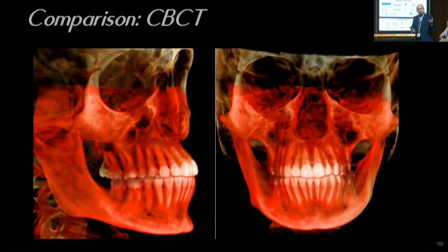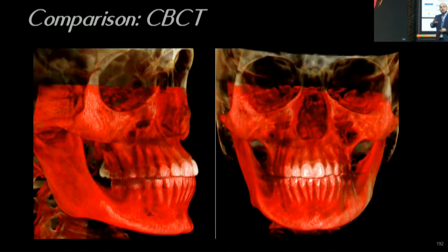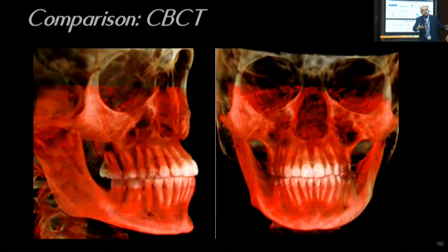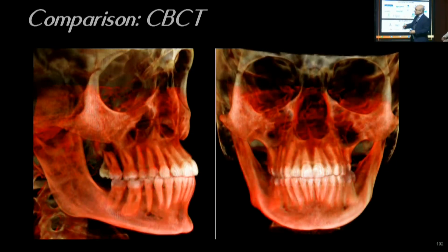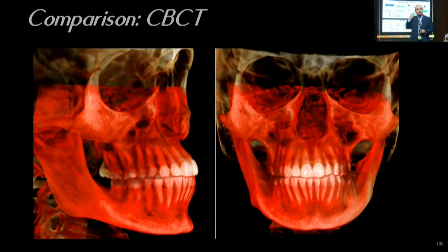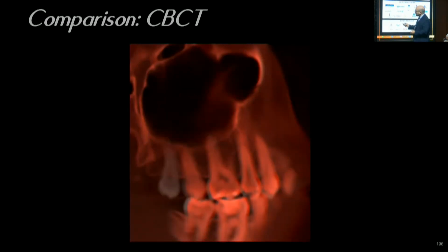All right, what happened to the CBCT? So again, I took a CBCT for her, and what was interesting to find, and I didn't expect to see this, you can see that the mandible actually is posturing itself into the right side. Because I intruded, the mandible kind of auto-rotated in a horizontal vector. This is something that is impossible to see or quantify using 2D X-rays. And this is where the 3D X-rays are really cool in looking at this change. So you can see how the mandible shifted a little bit. That helped with the midline as well.